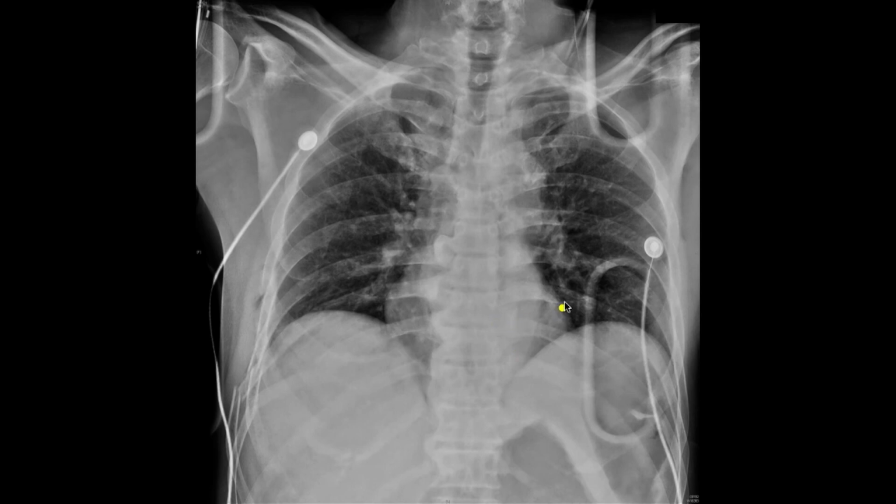So in this patient, the patient again is on a trauma board. You can see that they're on a trauma board, and so you're looking around the margins of the film, and when you're looking along the right lateral chest wall, can you see these small areas of lucency outside the chest wall, indicative of subcutaneous emphysema?